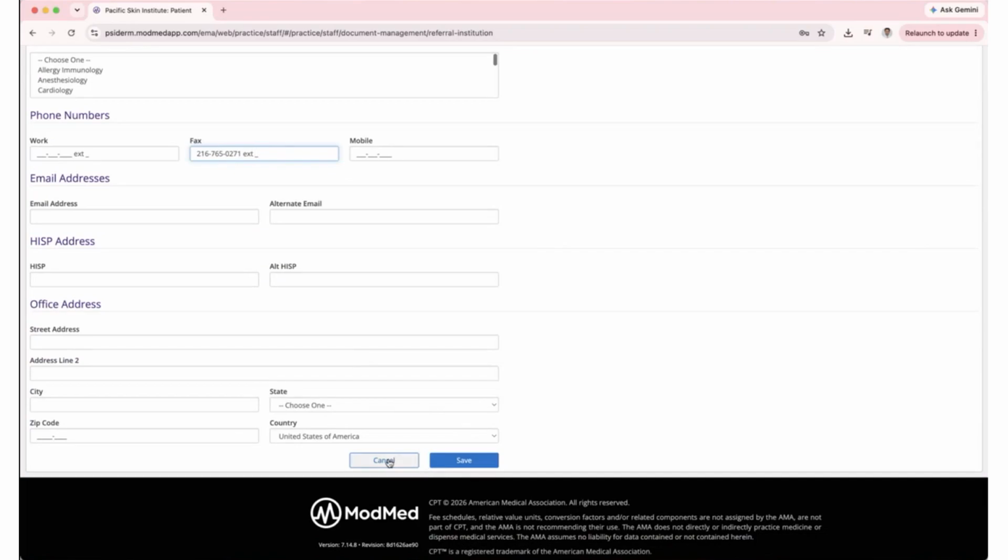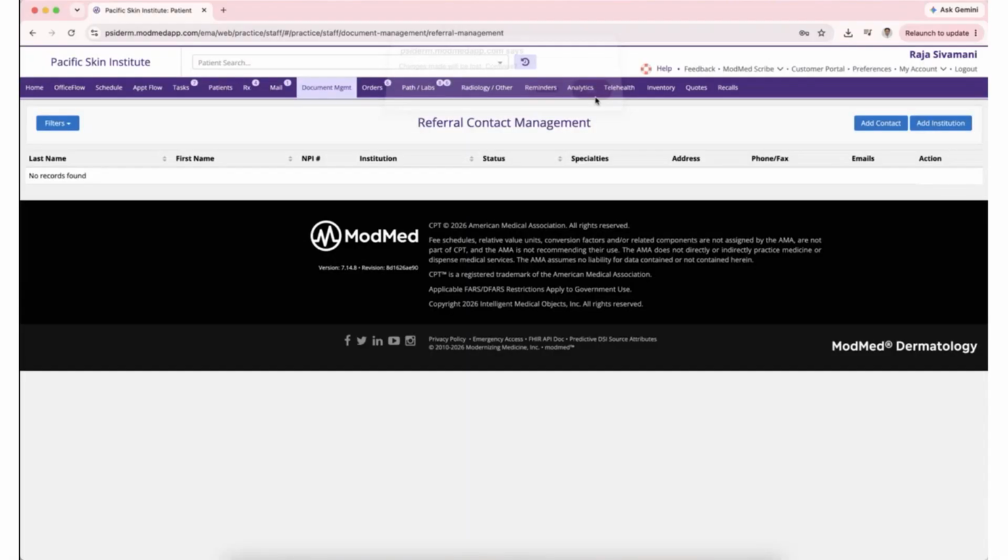Since I already have it, I'm not going to hit save here, but just know that what happens is then the referral contact will pop up, and then Matt, your point was that now this is embedded. It's a one-time step, correct? One-time step, and that will sync across all units on the same network, like PCs, iPads, etc.